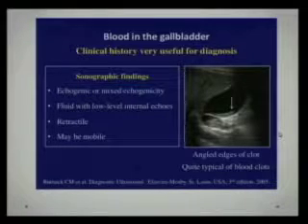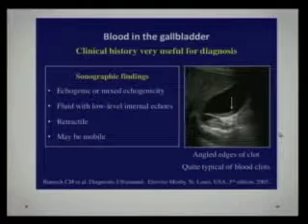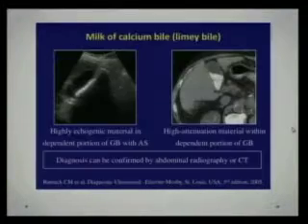They say there are a couple of findings that help exclude or include this diagnosis, and that is having beveled or angled edges. I'm not sure how far this is true, because I really haven't found that a very convincing feature in the 2 or 3 bloods that I've seen in my life.